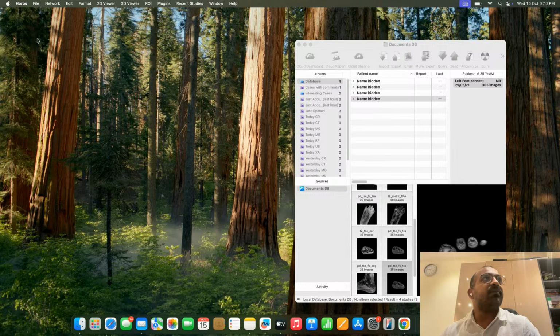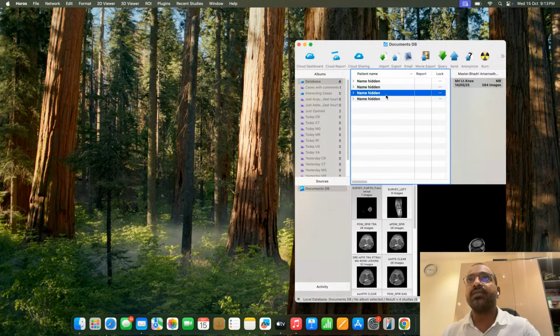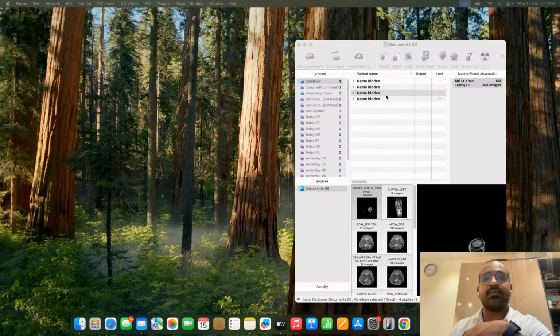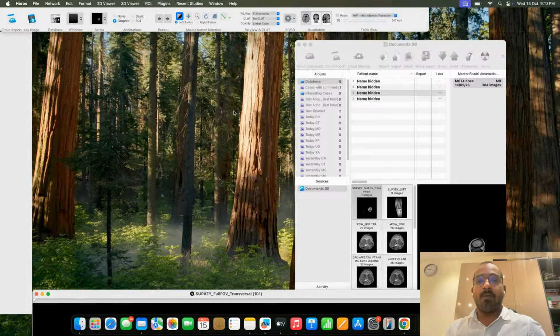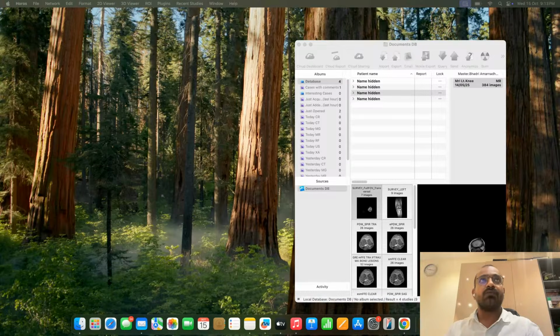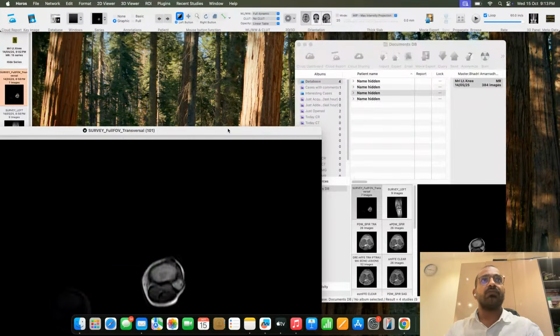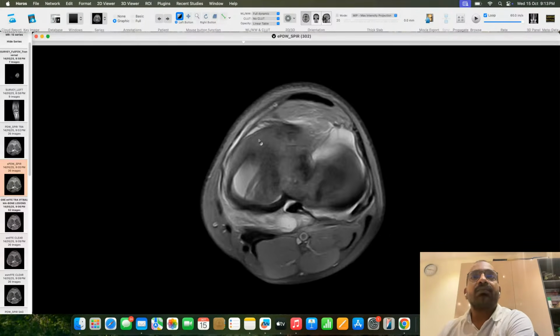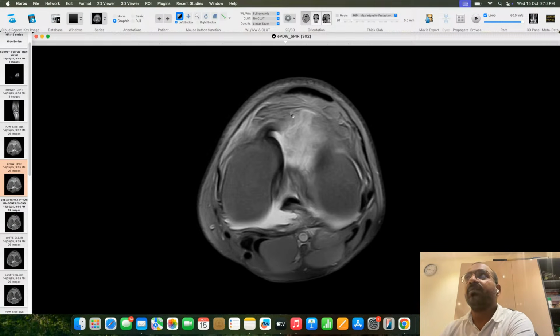Next thing is, this is also almost seen in most of the spotters. So this is an axial PDFS image.